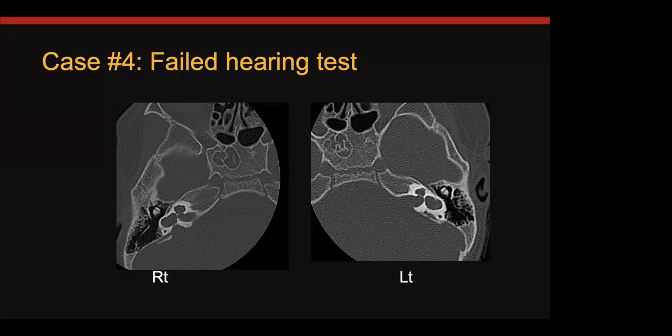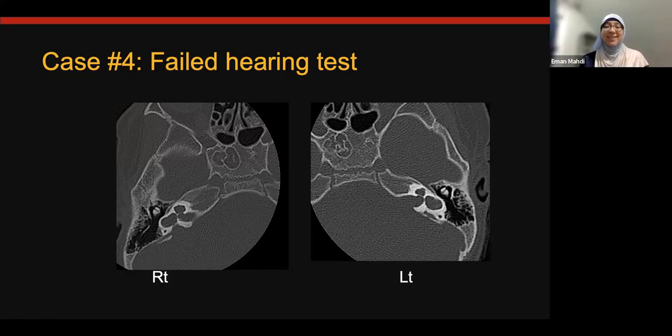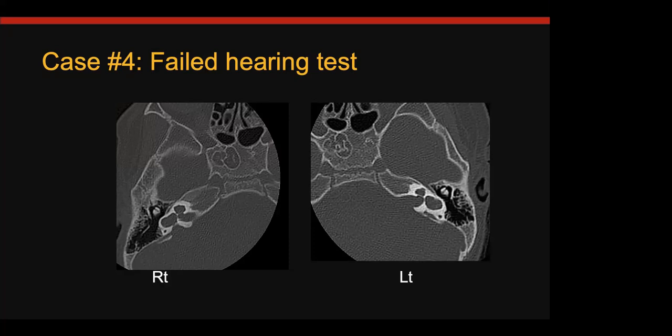Showing there is replacement of the cochlea with a cystic structure, might be Michel deformity. Okay, it's a hard case, but I think you get part of the abnormality, which is great. Okay, thank you. Cochlea replaced by cystic.